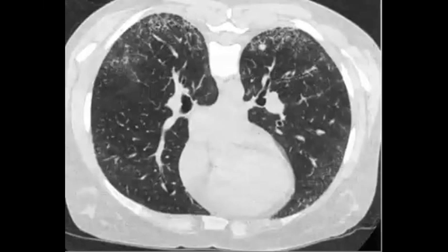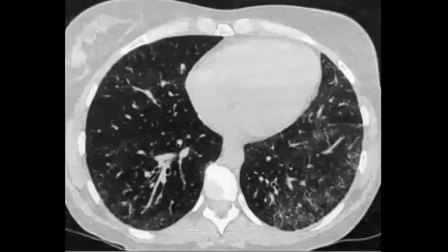This patient in prone position has shortness of breath, so there are some changes basally, and if you check them in the supine, these are changes you can say are ground glass, reticular changes, and some interstitial thickening. There is no effusion and there is no cardiomegaly.